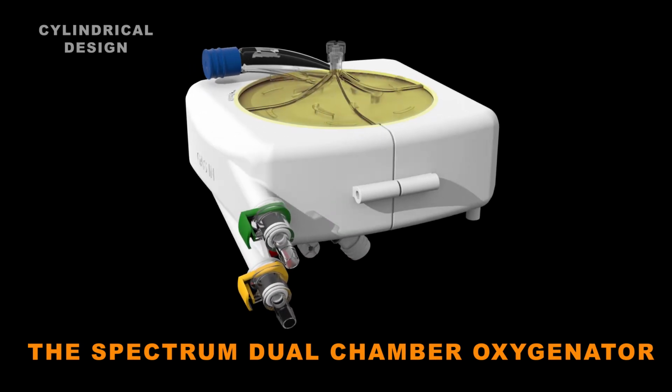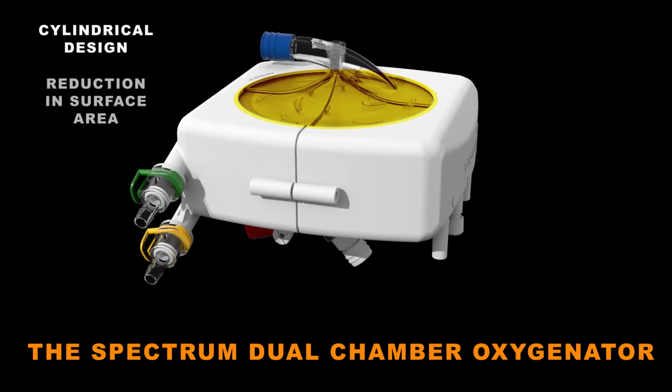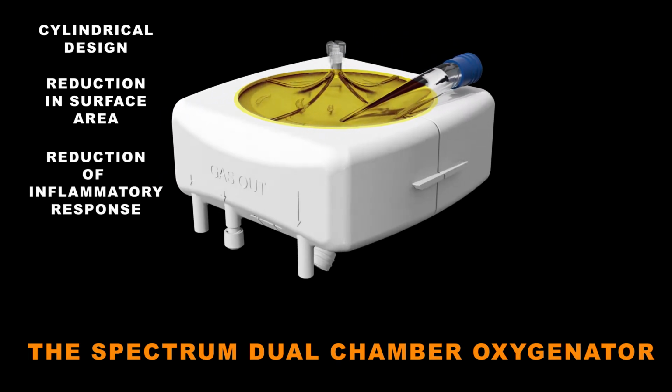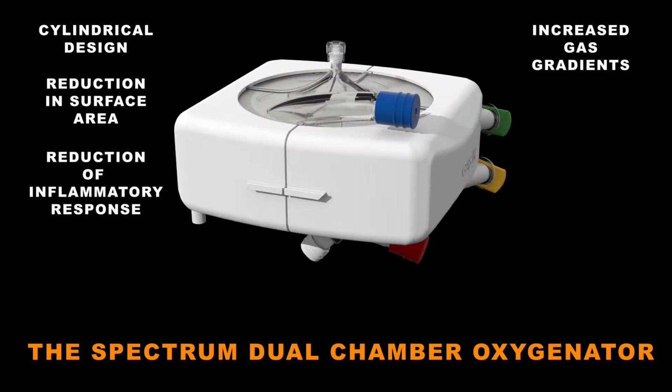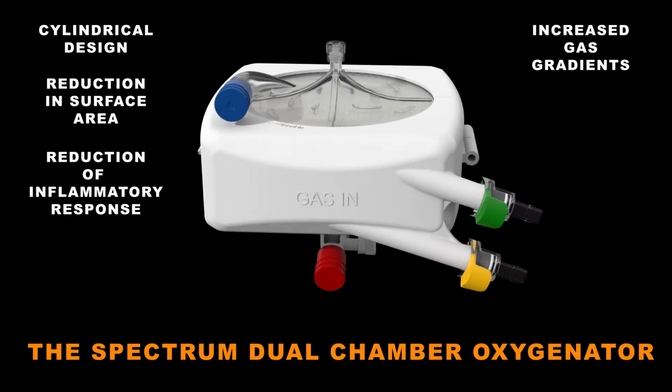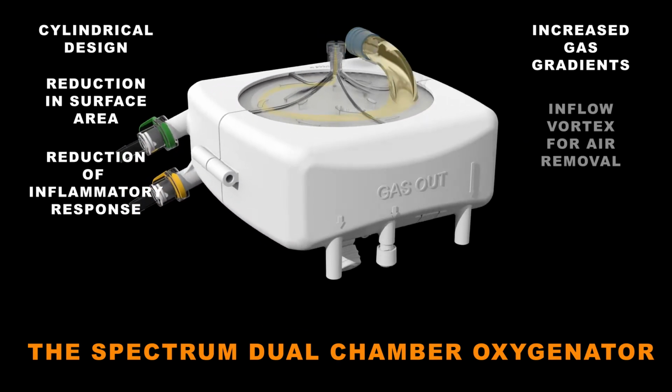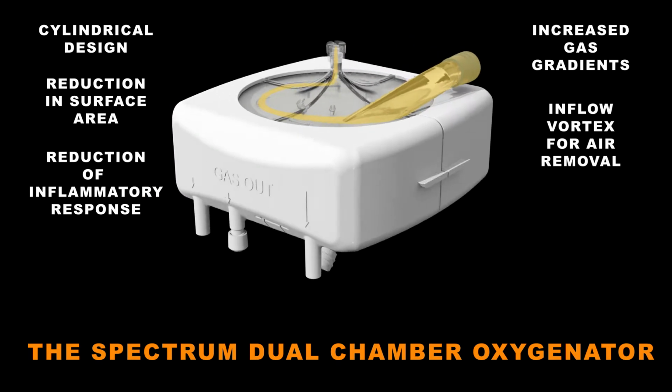Eliminate corners with a cylindrical design. Reduction in surface area. Reduction of the inflammatory response. Increased gas gradients across individual fibers per unit of exposed gas transfer surface area. And provide a specifically designed inflow vortex to vent gross air.